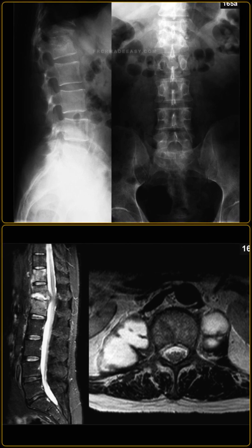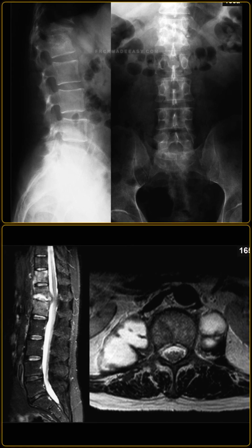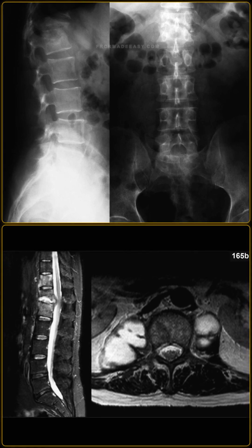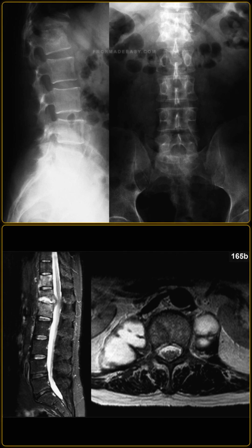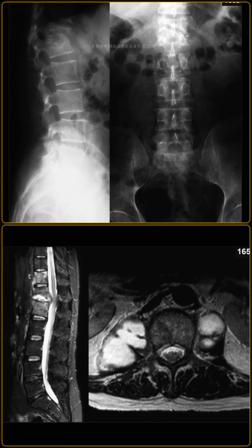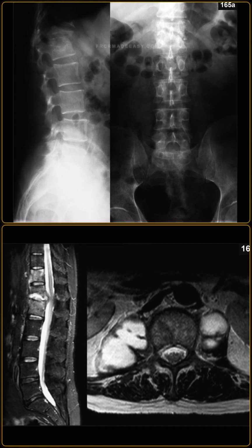How would you manage this patient as a radiologist? As a radiologist, I would recommend comparing these findings with any prior spinal radiographs. I would recommend a chest radiograph or CT scan to search for primary pulmonary tuberculosis, and a full spine MRI to screen for non-contiguous tuberculous skip lesions. I would promptly communicate the presence of vertebral destruction, canal encroachment, and psoas abscesses to the referring medical and orthopedic teams.